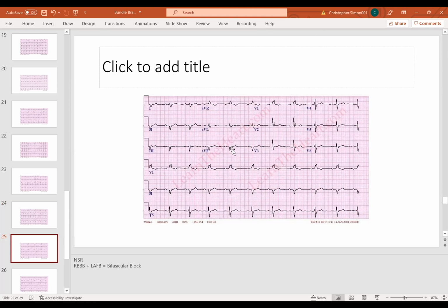All right, same thing going on again. So what do we got? Got normal sinus rhythm, P wave, P wave, P wave, and so on and so forth. Regular R to Rs. And got a little bit of wide QRS here. Got that double R on the top, right? Because one of the ventricles is depolarizing an extremely minuscule amount quicker than the other ventricle, which is kind of creating a mismatch, or being out of sync with one another. Not a big deal. It's okay.